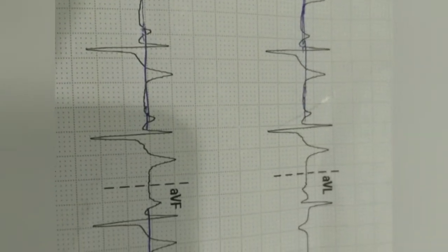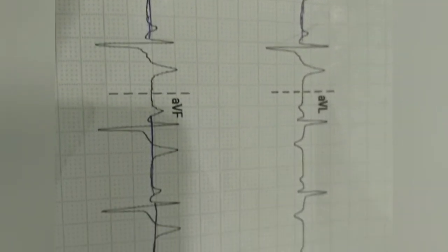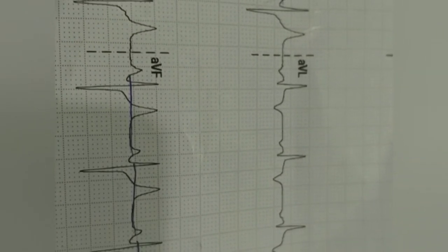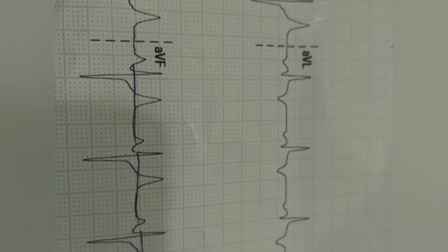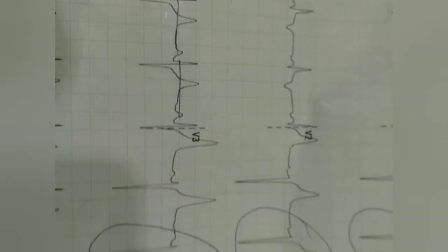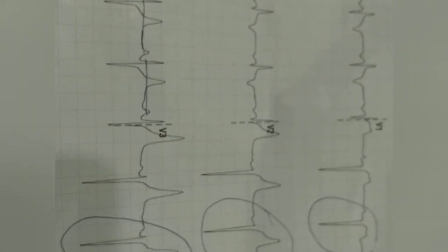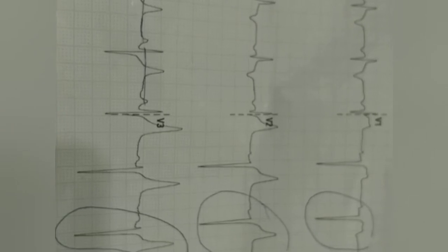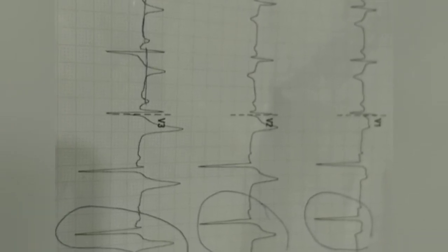If patient is clinically having problem and you find these subtle or slight changes, then you need to focus that something is not right with a part of the heart being supplied by one specific coronary artery. Now look at the changes in the lead V1 and V2 and V3. You see that ST elevation is becoming prominent.